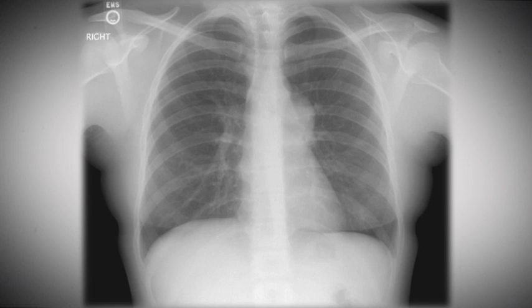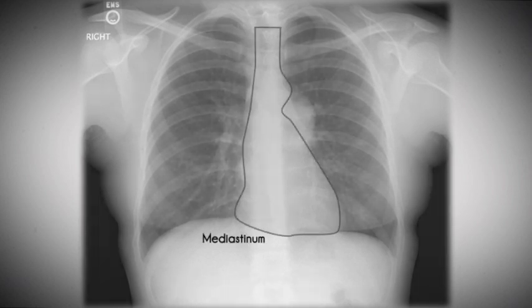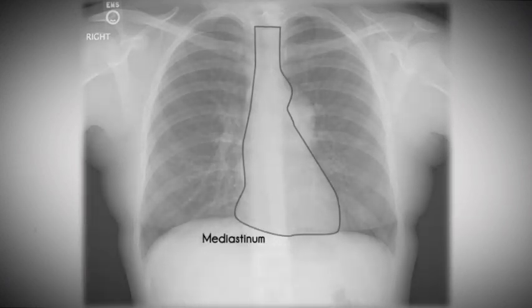Here is an illustration showing what is seen on the actual radiograph. There is a positive silhouette sign involving the left mediastinum in the area of the aortopulmonary window. The lesion is probably anterior because it is obliterating the main pulmonary artery, which is an anterior structure.